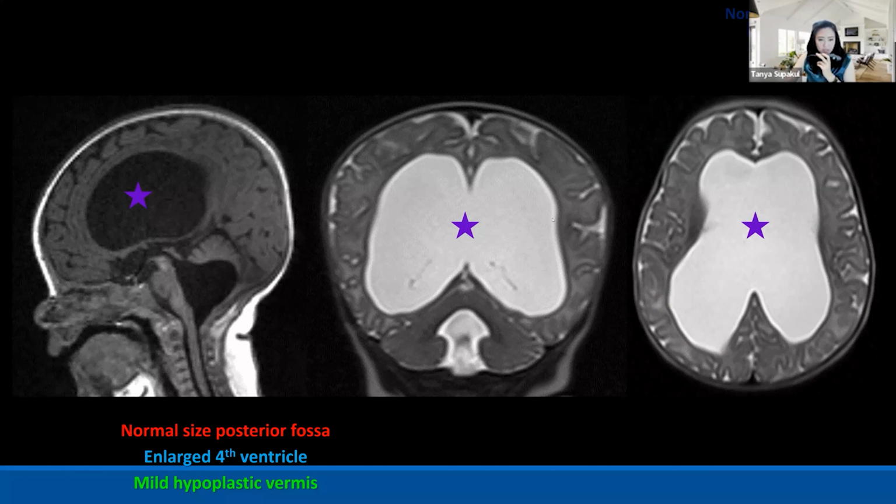And the first thing that you can see here is a very big ventricle, right? Patient has ventriculomegaly, a super big ventricle. And when you are trying to check if there is something abnormal for the cerebellar vermis, you can see the upwards of the fastigium. So this is one thing that we see, I mean, once or twice a month.